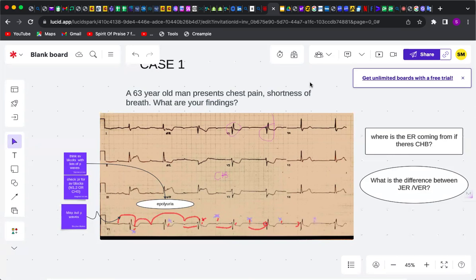Like I have always said, these videos are not going to take us back to the basics. Before you come in here, the basics on how to analyze an ECG, checking the rate, rhythm, the axis, and all that should have been done already by you. So without much ado, we could quickly analyze the ECG, and we could tell that this is a sinus rhythm. We have the P waves coming from the SA node, reaching down to the AV node, and so it's a sinus rhythm, yeah?